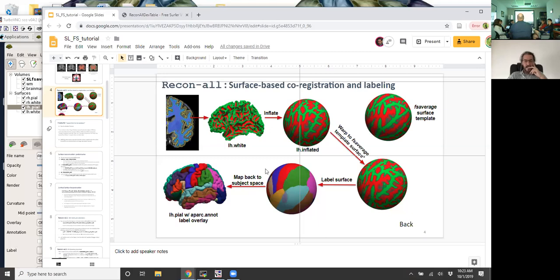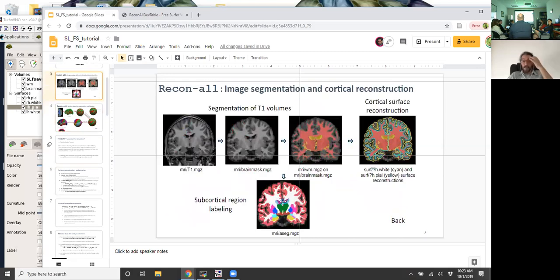So literally color it, so you can visually tease these regions apart. You also give it a name: number 3, we're going to color all those voxels green and call it thalamus. So the color table is that link from the value assigned to the region label, something useful.